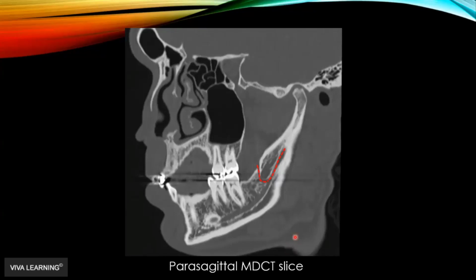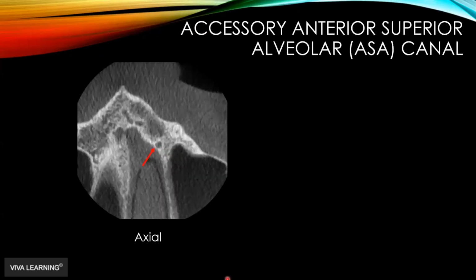Remember, if it hops on that nerve and it can get across the masticator space, where's it going to go? It's going to go back up through foramen ovale. So it has significant implications.